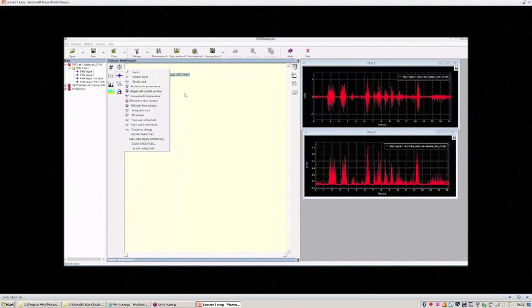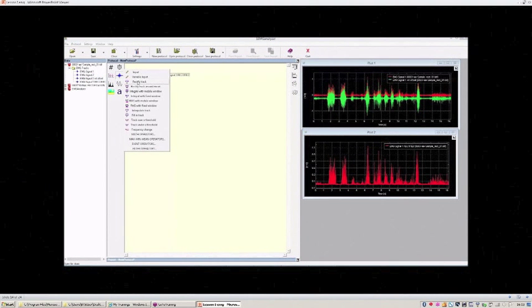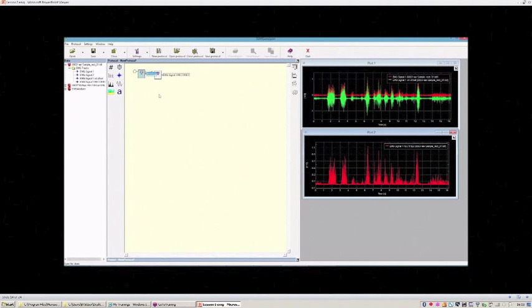The second option that we have is the rectify track around mean. This second operation can be useful if you have a signal like this one. As you can see, in this case the baseline of the signal is not set to 0, but we have an offset.